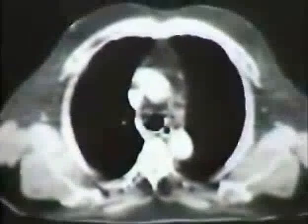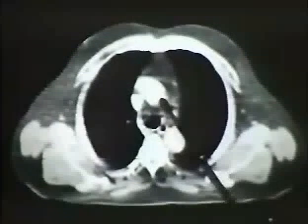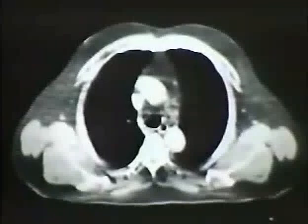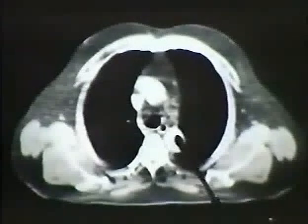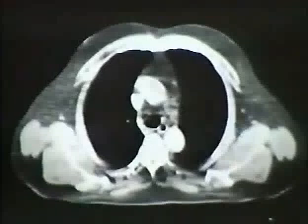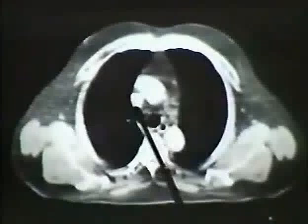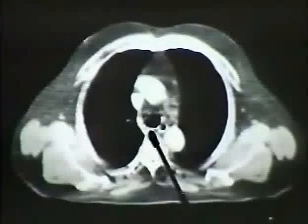If we move down right into the AP window in this patient, you'll notice all sorts of irregular densities in here. Now, I'm sure that one of those is, in fact, the ligamentum arteriosum, but I really have no idea which. The other densities presumably represent small lymph nodes in this region. We now, of course, have a descending aorta and an ascending aorta that are separated. On the right side of the mediastinum, we have the superior vena cava, and curving around from its posterior wall to the front of the spine, we have the azygous vein, which we'll look at a little bit more in a while.